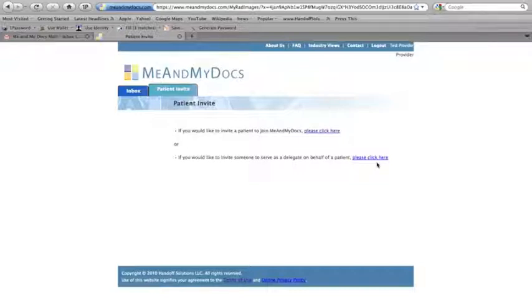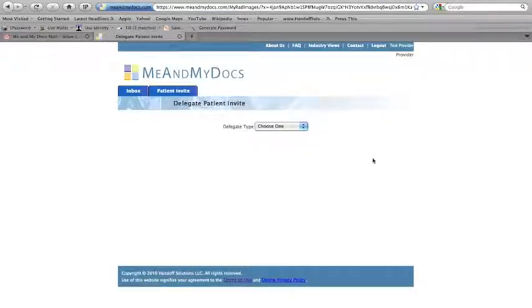It could take 5 or 10 or 15 minutes to upload a study, so we don't want the doctors waiting there. But you click upload here, and you'd say, well, who's going to upload the study? Is it the referring physician themselves, or is it somebody else? Now, we'll take the other person first.